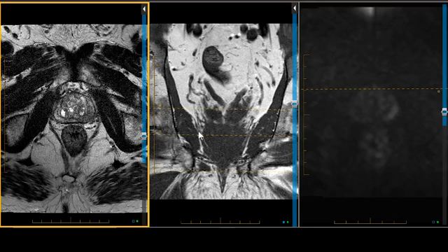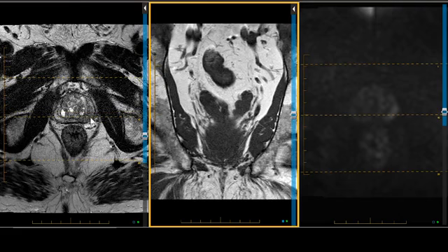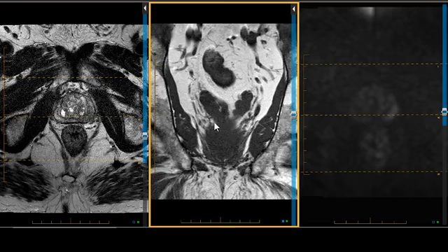I'd prefer to have an axial T1, but I'm blessed at least with this coronal, and I'm looking at the neurovascular bundle right in the area of the tumor, so I'm scrolling backwards to that area of ill-defined character, and I really don't see any effacement of the fat on either side. I still see the veins and the neurovascular structures. That's a nerve right there. And so they're unencumbered by the tumor. So we're not going to give this patient gross invasion. There may be microcapsular invasion.